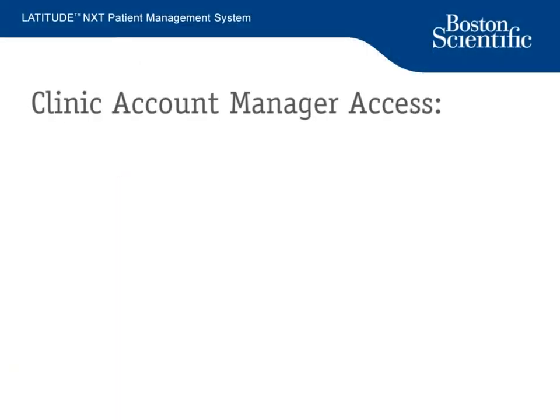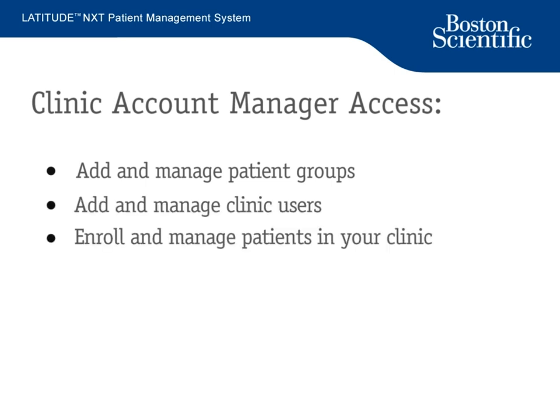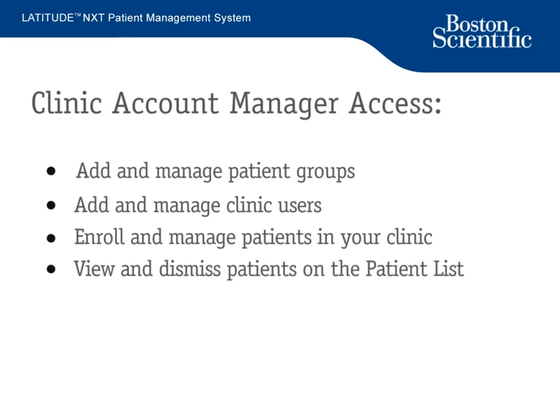In Latitude NXT, clinic account managers have access to add and manage patient groups, add and manage clinic users, enroll and manage all patients in your clinic, view and dismiss patients on the patient list.